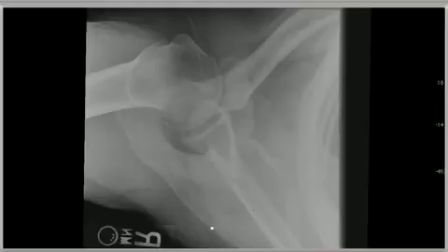The scapular spine comes up around here to form the acromion, and one sees the distal clavicle coming over to form the AC joint, sometimes well seen. Good idea to look at the alignment of the acromion and the distal clavicle in this projection as well.